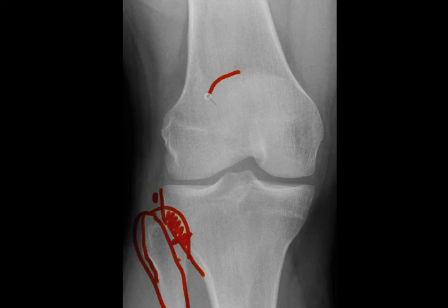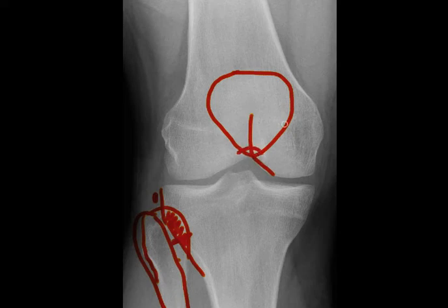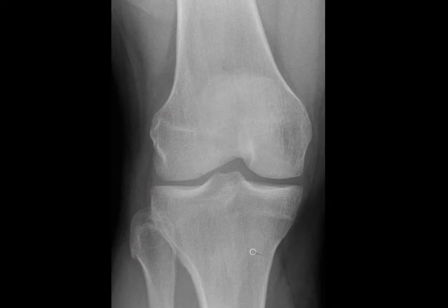Look also at the position of the patella. The patella should overlap the intercondylar area and the medial femoral condyle. When the patella is dislocated, it tends to lie in a more superior and lateral position, and it is only picked up if one remembers this relationship. Also remember to look for any evidence of stress fractures of the tibia, as well as any fragments of bones which could represent loose bodies.